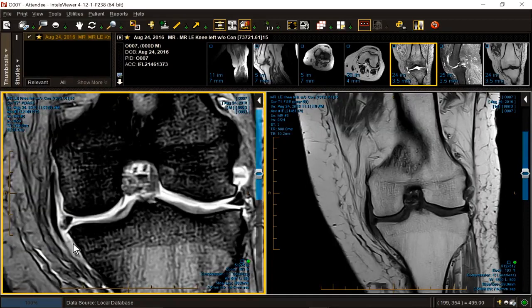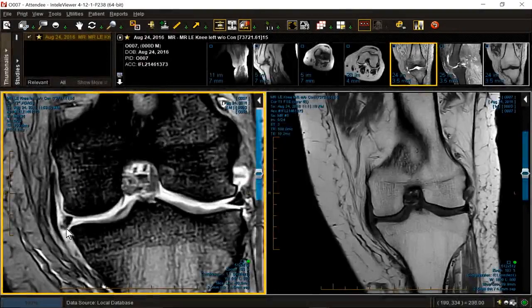So is it contributing to symptoms? Probably, but what are you going to do about it? If there's locking, probably remove it. If there's no locking, then probably sit on it. In younger people, highly functioning, busy, athletic individuals, they will go in and remove these when they start to go down into the paratibial gutter. So this subtle gutter extension could be relevant in a younger person.